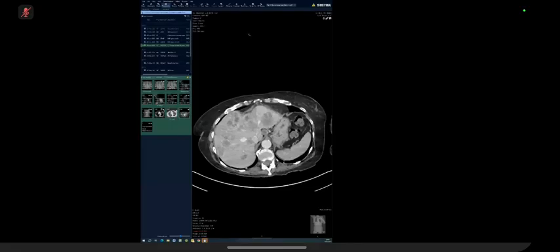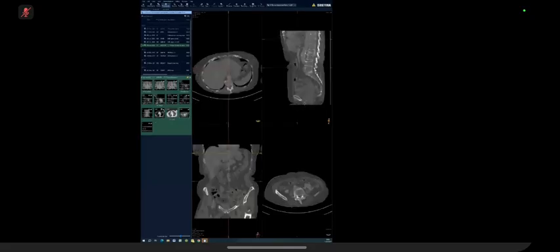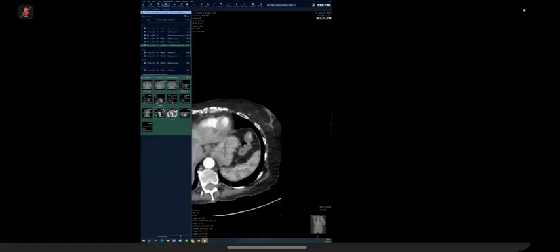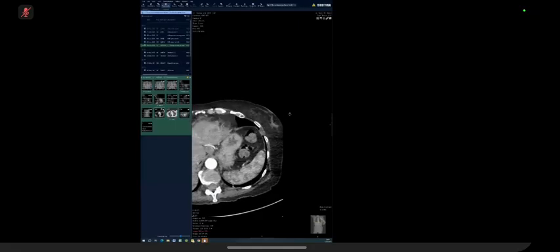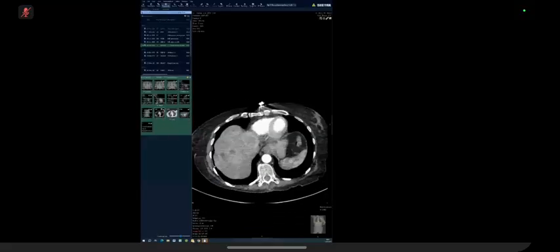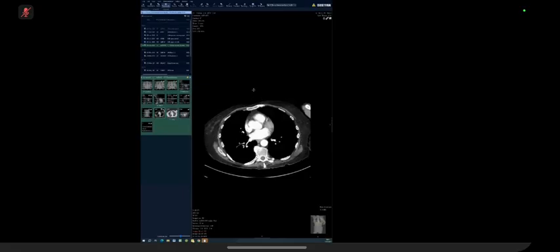There is a spiculated mass in the left mammary region. So a tiny spiculated mass. So this could be a primary breast cancer. There is also a collapse of L2 vertebra. Are you looking at this? I think that's nothing. It's just breast tissue. Okay, there's a right mastectomy. There's no mastectomy. I think it's just an old patient. They're a bit asymmetrical. The breast tissue is normal.